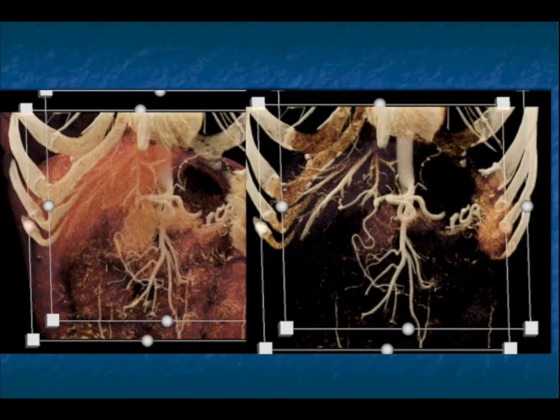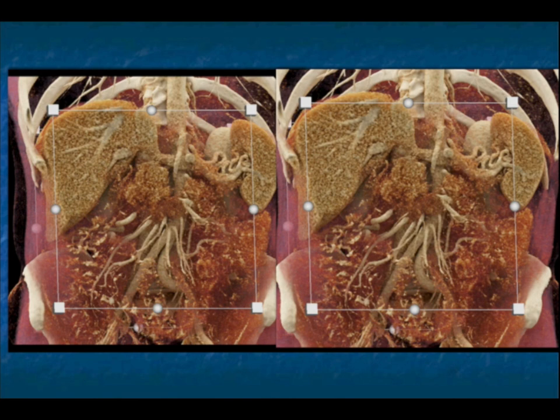And so here it is with texture mapping. The celiac and SMA are okay, and the patient's GDA is fine. But now when you look at the texture map, there's a mass here, which is involving branches of the SMV. This is the pancreas, but this is different texture. Yes, you can say, how do I know that's not inflammation? But if you look at its density, it looks like a tumor.